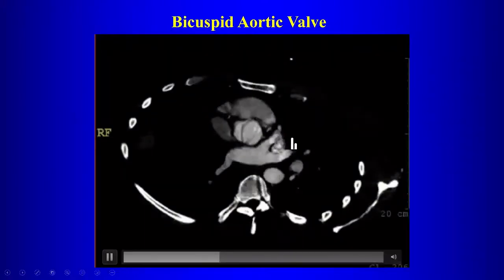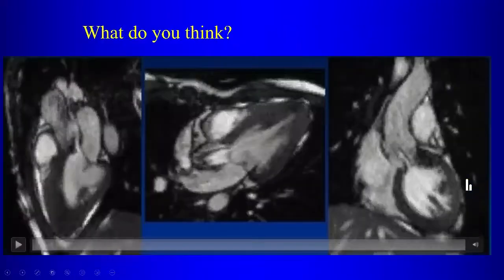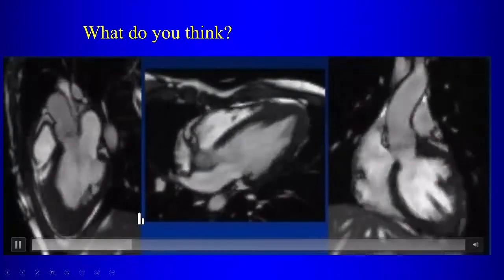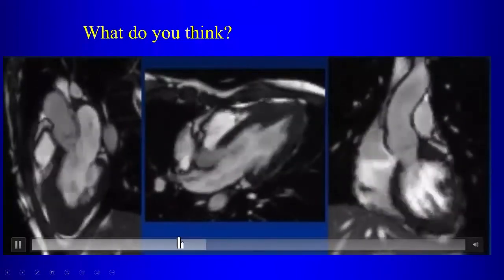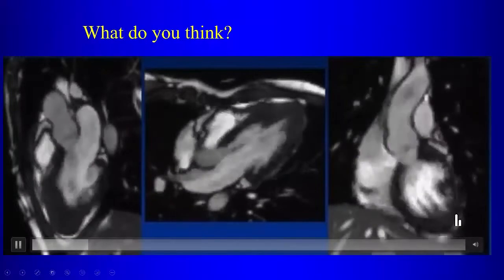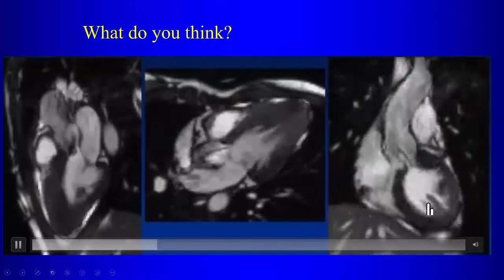Here's another CT showing you this pure bicuspid morphology of the aortic valve. This one is not so stenosed, not much narrowing there for that example of the bicuspid aortic valve. Okay, so over here, you guys, let's look at this. We're looking at 3 different views here. What kind of view is this? This is a left ventricular outflow. This one, kind of a 4-chamber-ish, right? This one, it's kind of a coronal view through the ascending aorta, all right?